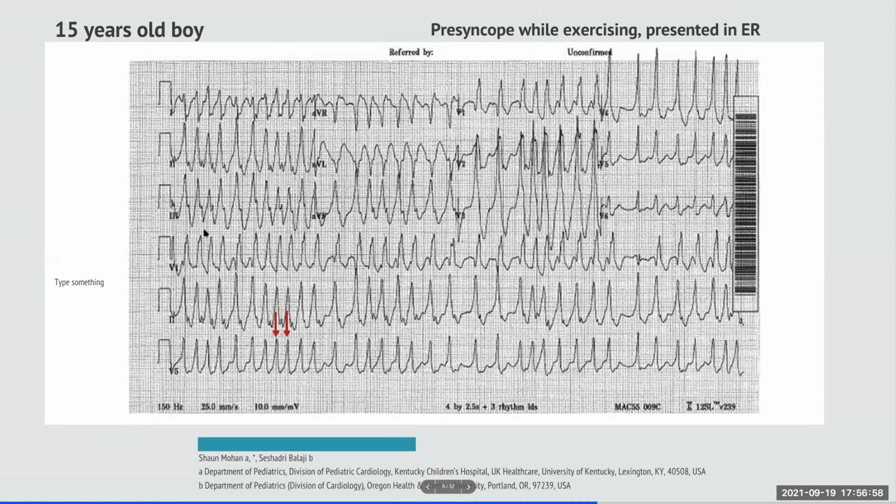So this is something which is called atrial fibrillation in somebody who has got Wolff-Parkinson-White syndrome, and if you ablate the pathway here, you save a life. Okay, so this is wonderful to look at. Very easily missed, but again, if you go through your routine, you will come to the finding.